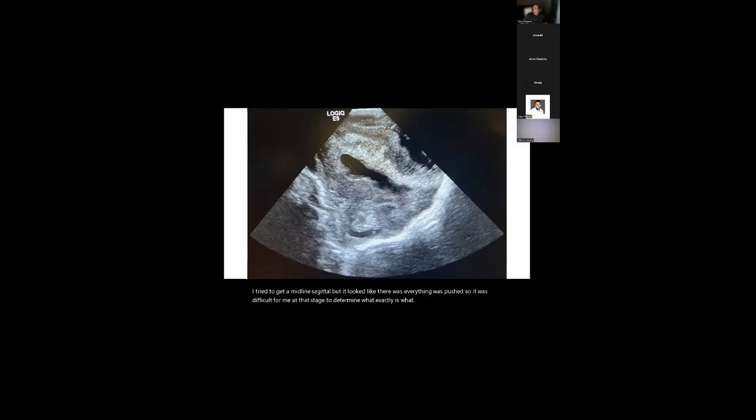So that is the cerebellum. This is the cisterna magna. This is basically the midline ventricle. This is probably the corpus callosum. And you get this large area of breakdown. Again, you can see the hyperechoic margin over here.